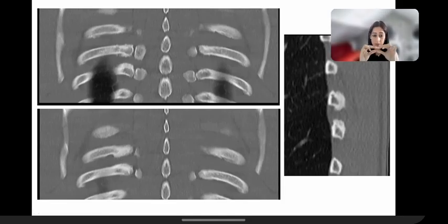The intercostal space is really narrow. There is something happening which is resulting in this new bone formation on two opposing ends of the rib. You see this new bone formation at the cranial border and the caudal border of two ribs, which are close together in a closed space. Just a sagittal scan to appreciate this.